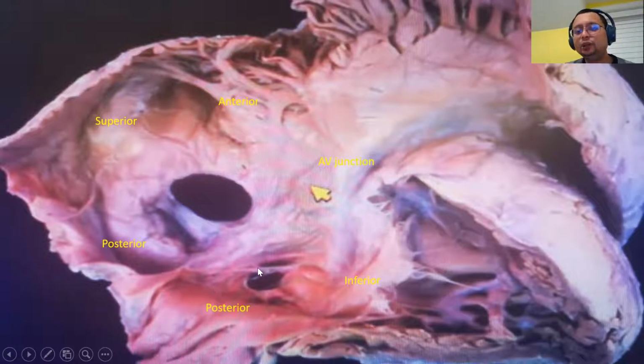So what is the rim? So you have anterior, posterior rim. So in TEE, the anterior is the aorta. So whenever you see the aorta, you are at anterior, posterior. Your bicaval view is superior vena cava and inferior vena cava. Your TEE four-chamber view is AV junction and posterior. So that is all your rim.